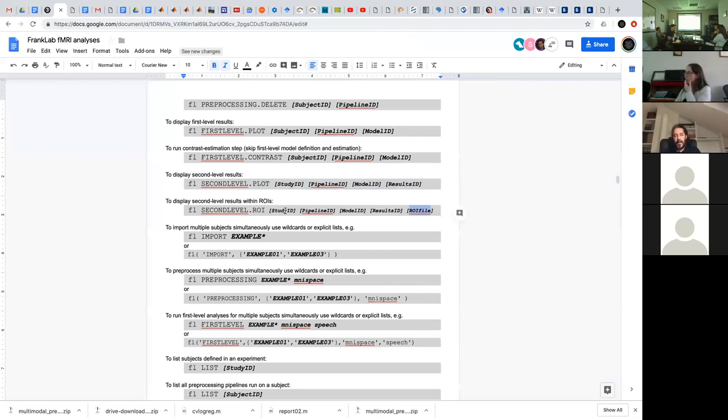It is using the MNI 152, well, it's the SPM convention here, so it's using the SPM 12 preproc routine, this dual normalization and segmentation routine. I think it's fine-tuned to the MNI 152, although in practice it's not actually a template, right?